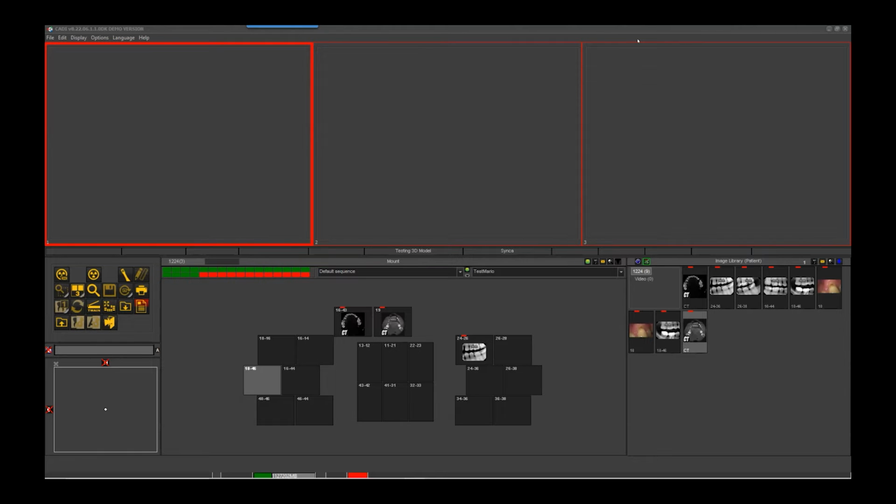I think so. Hearing you say the two-way bridge into Open Dental, I think that's the icing on the cake, right? Because we're a heavy ortho office, and I think I had mentioned to you earlier, our problem is that our intraoral camera and our sensors work well with Apteryx currently, and they are kind of in Open Dental.